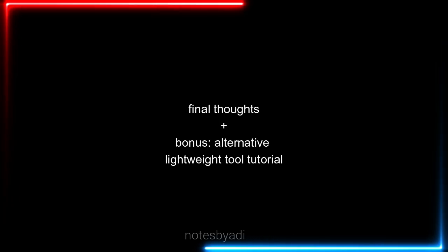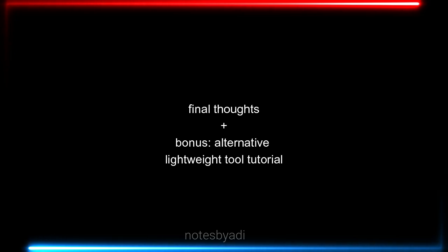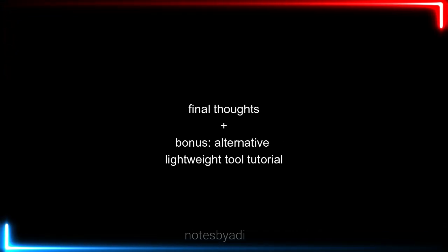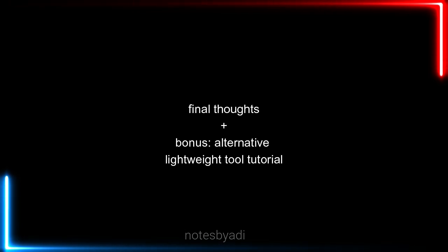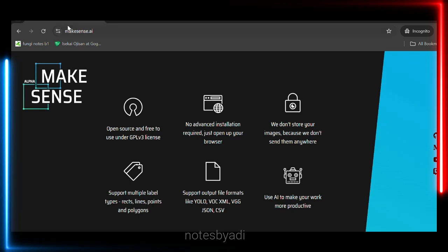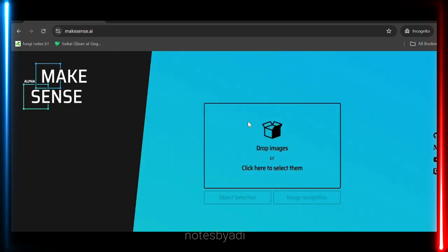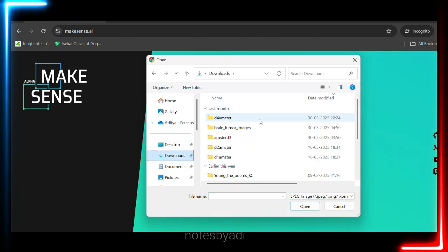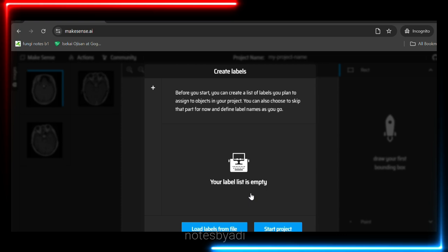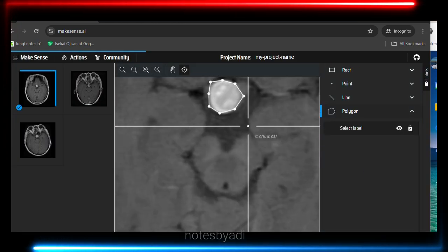As a final note, CVAT is a great tool for subdivision of tasks in a team, especially when the annotation projects are big and cumbersome. There are some other tools for annotation of images which are more for lightweight applications. For example, Makesense AI, but it only allows online annotations for very simple and small datasets and does not have the advantage of CVAT, which allows division of tasks among people as an admin user or with secure login credentials.